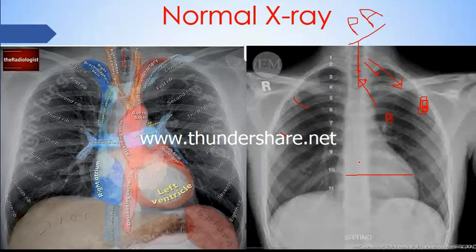But now in the COVID-19 patient, the affected or focus area is the lungs, so we should know about the lungs. In the lungs, you should look at the apex of the lung, whether tension pneumothorax is present or not, and also you should look for the costophrenic angle, the angle between the diaphragm and the ribs on both sides. If it is not present, it means there is some fluid in the pleural cavity, or pleural effusion has occurred.